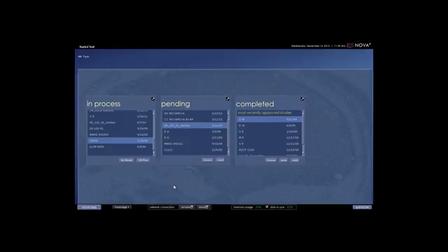We start with the institution's standard 3D time-of-flight MRA. After that sequence is completed, they will push it over to the Nova workstation, and it'll transfer over the network and appear here in process. So all I need to do is select that study and load the time-of-flight MRA images.